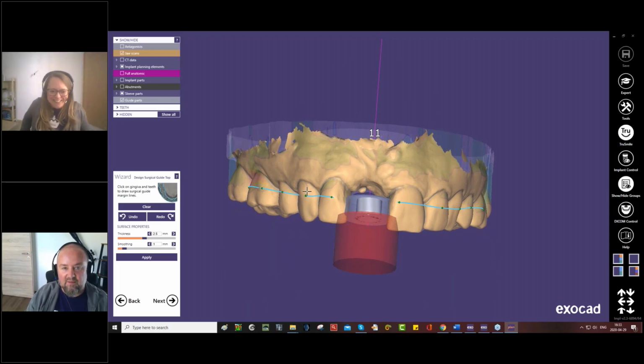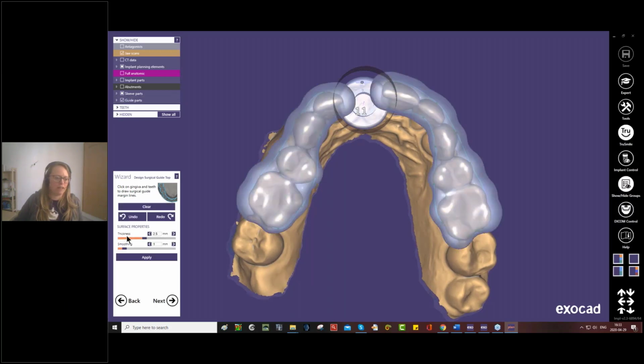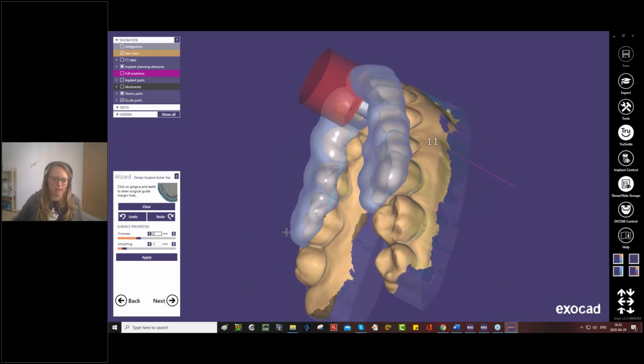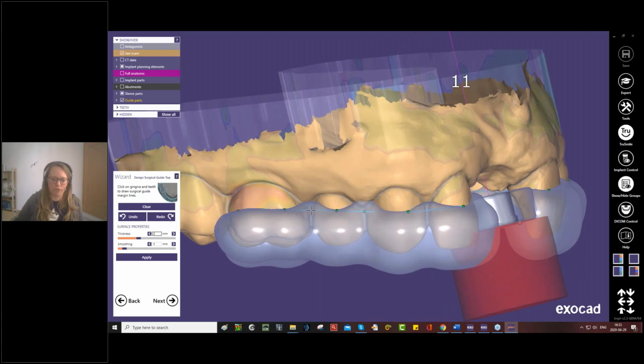It's perfectly answered. Okay. So I've drawn the 2 curves here, and I will apply them. So before I apply, of course, I can choose the thickness here, but not a problem. I can choose it now and just apply it again. Let's take it 2 millimeters. Let's check the appliance here. If I see, okay, I want it to be tighter here, I can just add points here.